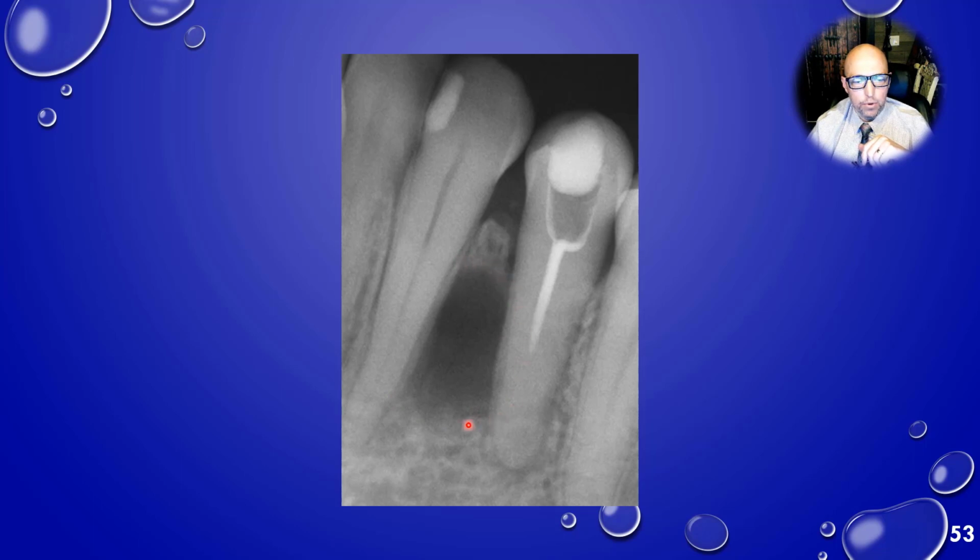You see these rounded borders of it. And so you might have lateral periodontal cyst, top of your differential. It could be a lateral radicular cyst. But when things are small like this, it could be anything. So it could be our DOA acronym. I've seen Ameloblastomas look like this. So everything starts small, starts round, well-defined. Could be either of those. This one turned out to be an OKC.